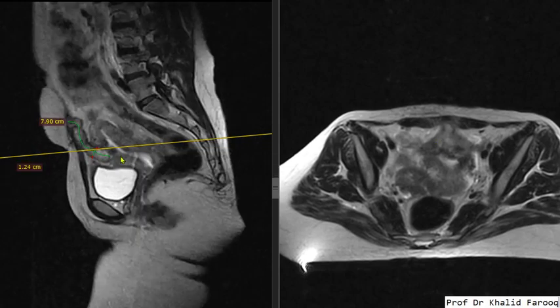This is 7.9 centimeter obliquely oriented fistulous tract, and it is called as Uterocutaneous Fistula. It is a very rare case, as in last 200 years we have seen only 120 cases.